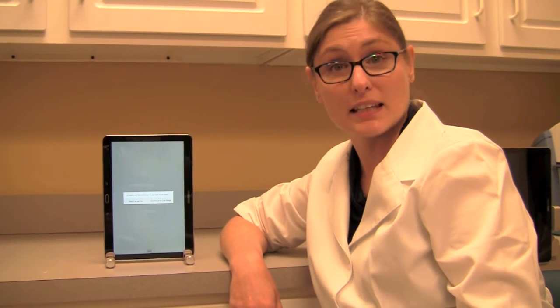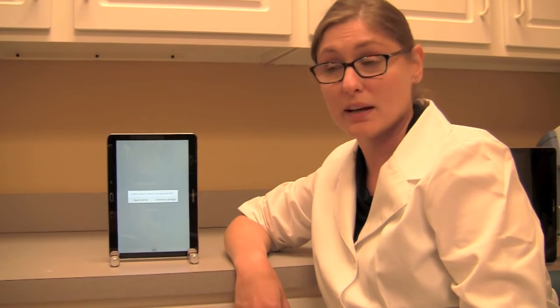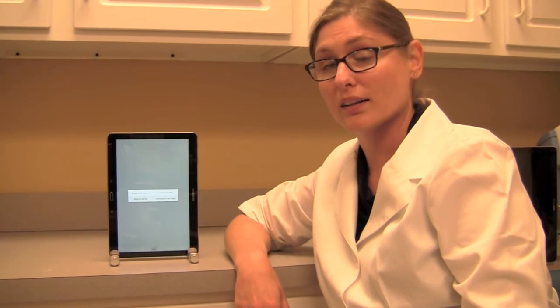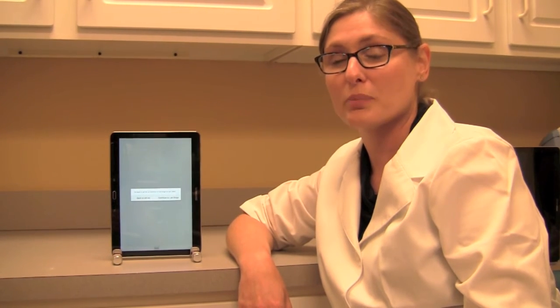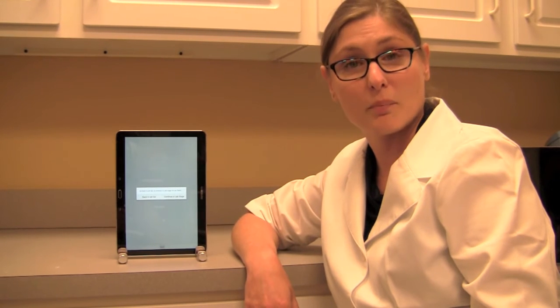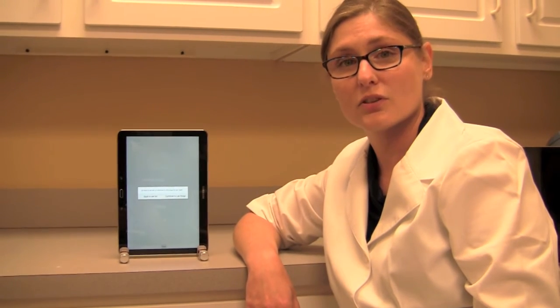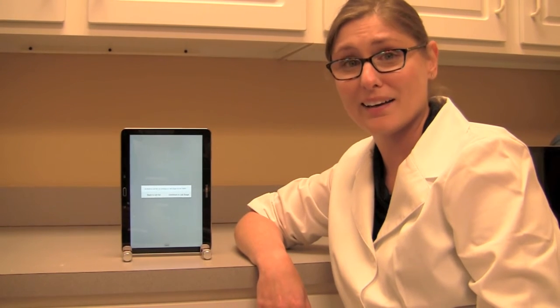So that's it for Max in the dental office. The next step is to send this information to the lab via email. You're also going to want to include to the lab or the person doing the mounting your high quality impressions or your nice diagnostic models, as well as your bite records. Another key tip is to make sure that you email a copy of this information for yourself so you have that in your dental record at the office. And that's all. Easy as pie.